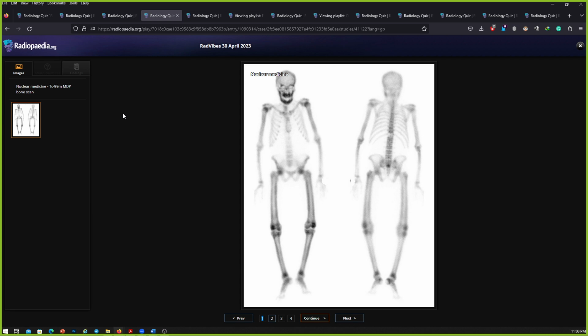So for differential diagnosis, this super scan could be metabolic or less likely metastasis. It is not affecting the axial skeleton and there are no focal masses. It's homogeneous. So I'll think of metabolic causes, with renal osteodystrophy at the top of my differential diagnosis, and Paget disease. There's uptake within the mandible, which could represent the Lincoln sign of Paget disease as well.